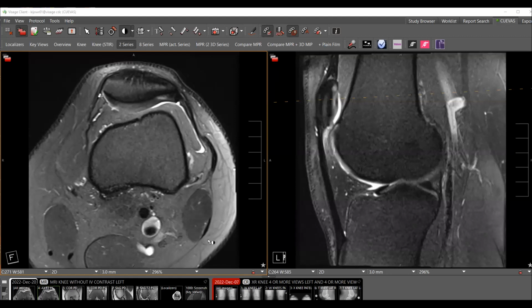Now, the difference between cartilage fissures and cartilage flaps is that in cartilage fissures, the defect between the articular surface cartilage is much thinner than in a cartilage flap, and a cartilage fissure is not associated with a free edge, which is unstable and loose.